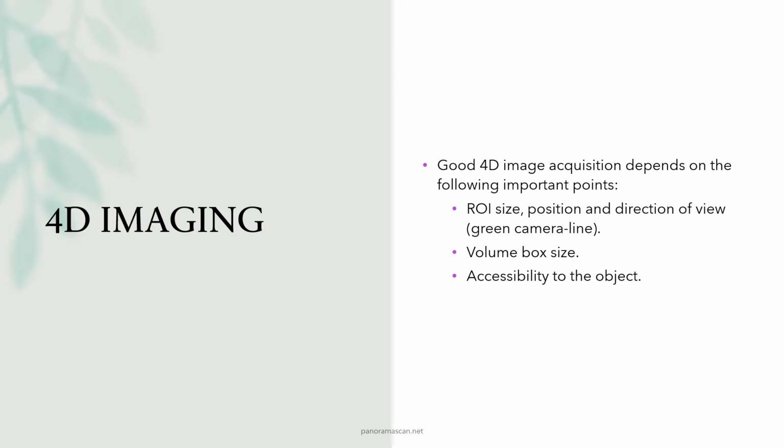By taking into account these additional factors, such as adjusting for anechoic regions, minimizing artifacts and preparing the patient properly, you can significantly improve the quality and accuracy of your 3D and 4D ultrasound images, ensuring the most precise and detailed results for clinical use.